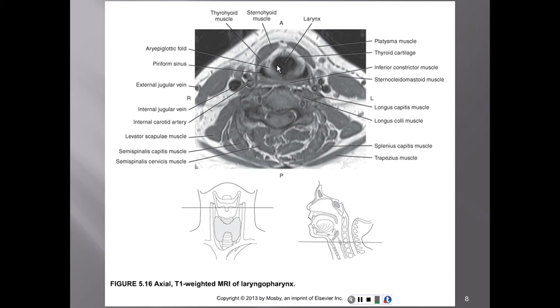And here we can again notice the sternocleidomastoid. Remember, I said this is a very important muscle. So you always want to pick this one out. If there is a muscle in the neck that you want to know, it is the sternocleidomastoid muscle right there. There's the other sternocleidomastoid muscle. It actually separates the anterior and posterior triangles of the neck. Because there are certain anatomical structures that live in the anterior triangle, certain structures that live in the posterior triangle, the sternocleidomastoid is the border for the anterior and posterior triangles of the neck.